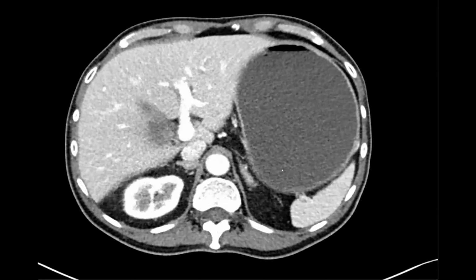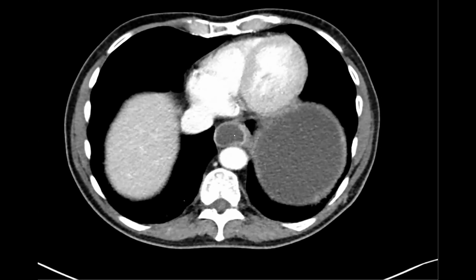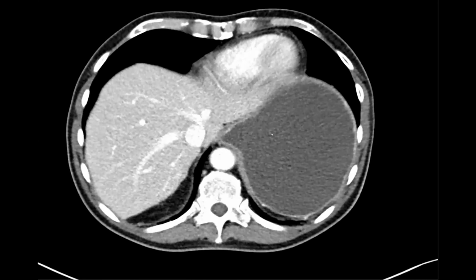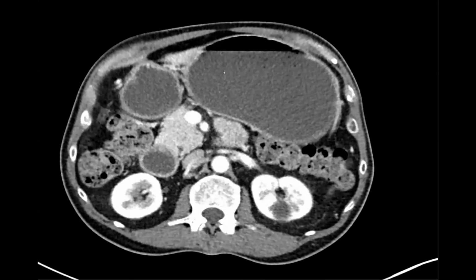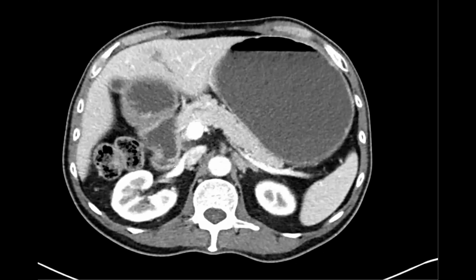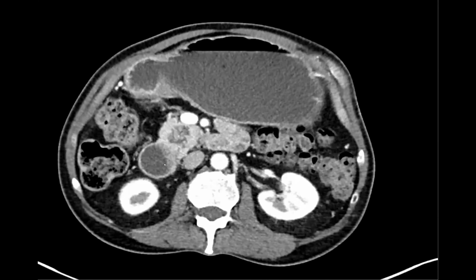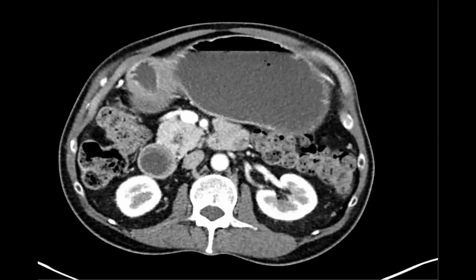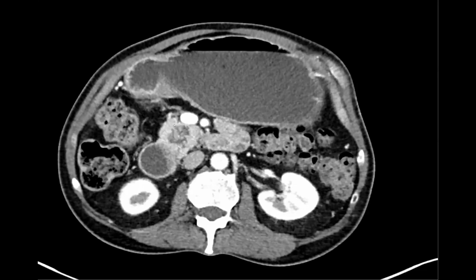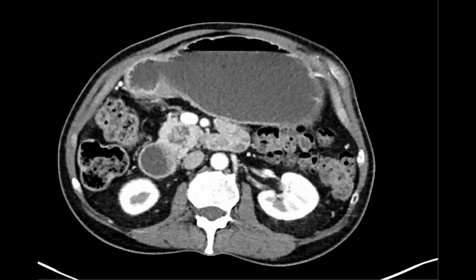Okay, so you can see that this different patient has fluid going up their esophagus. It looks like their stomach is very distended. The duodenal bulb is also distended. And then we have this interesting thing going on in the pancreatic head, uncinate process. Is it like a duodenal diverticulum with a malignancy in it? Oh, that's a great thought.